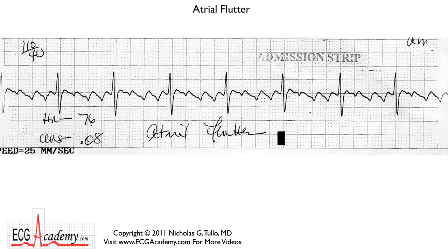This is an example of a rhythm strip in a patient who has atrial flutter. And in this case, at least, you can believe what's written on the strip. I vouch for it this time.